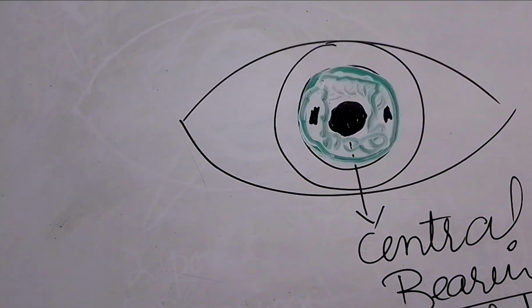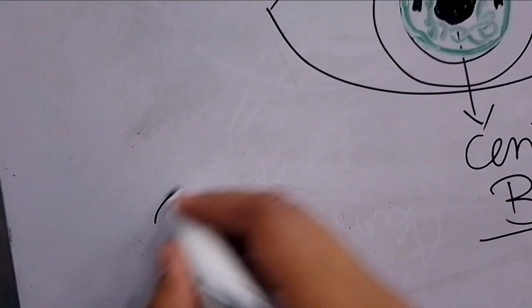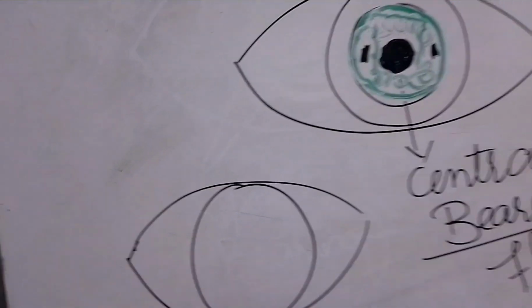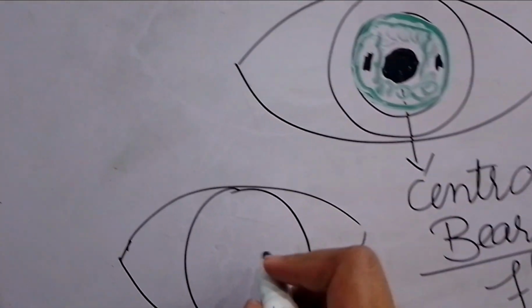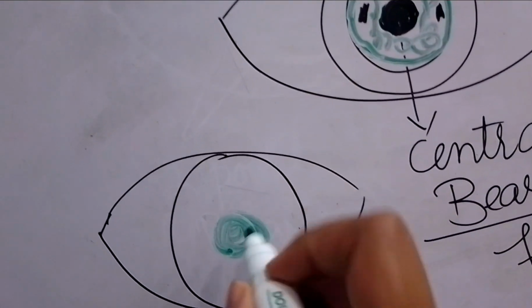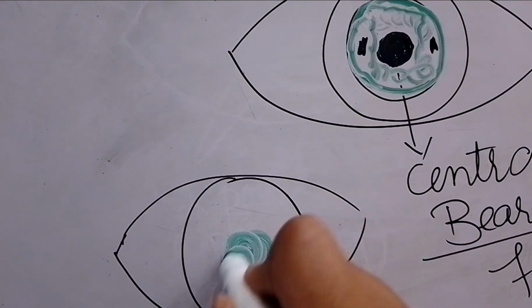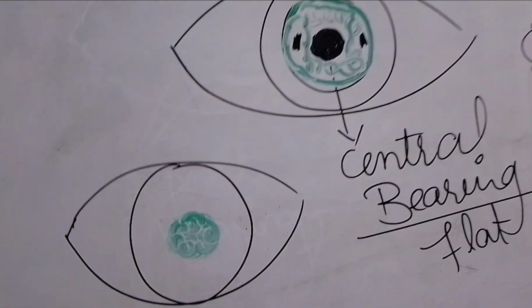The only thing I'm going to do here is draw a steep fit so that you can compare the steepened and flattened areas. There is so much pooling here that you are unable to see the pupil. I'll add the pictures also so that you can understand.